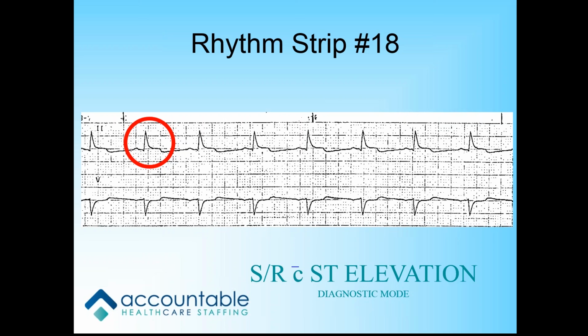This is a STEMI patient, because if it has an ST elevation, then it's a STEMI patient. So you take the patient to a cath lab? Yep. And what's another treatment that they could possibly do for this if cath lab is being held up for any reason? Thrombolytics. Thrombolytics, okay. Yeah, that's an alternative based on what their history is. Okay. Thank you, Irene. You're welcome. Next.